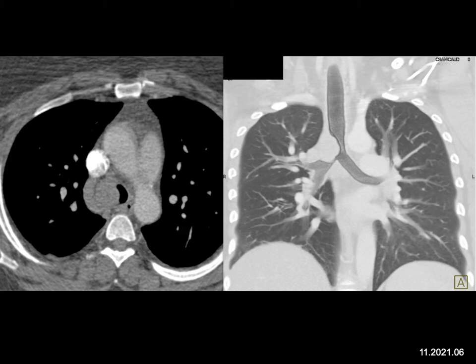You could think about a bronchogenic cancer, I guess, growing into the trachea, but this is pretty smooth. And when you think about tracheal tumors, the one you think about is an adenoid cystic neoplasm. In the wall, you can see it very nicely. It's smooth. Occasionally it bleeds. Usually the patients present with dyspnea as the classic presentation.